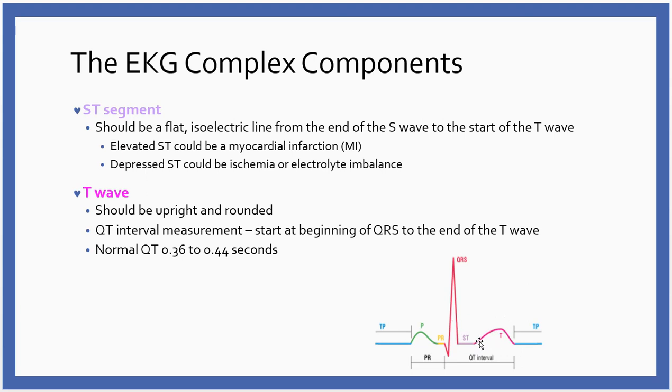Remember, this was depolarization. This is repolarization, where we have to have the sodium-potassium pumps pushing sodium out of the cell and putting potassium back in. So it requires energy. And so that's why it's important to look at this and make sure it looks the way it should. So we look at it, and then we're going to do a measurement.